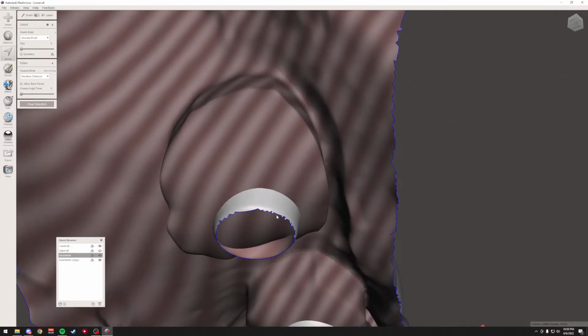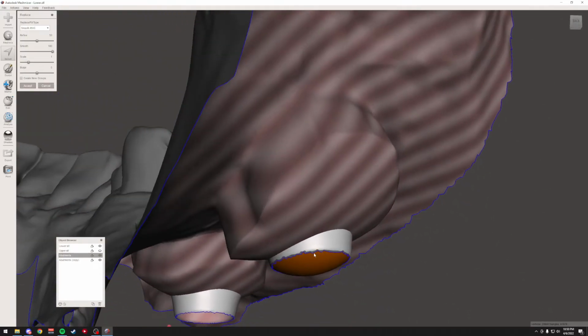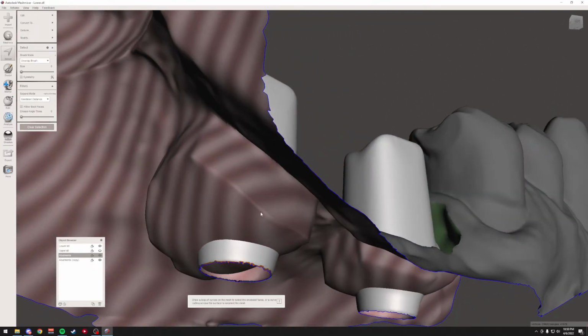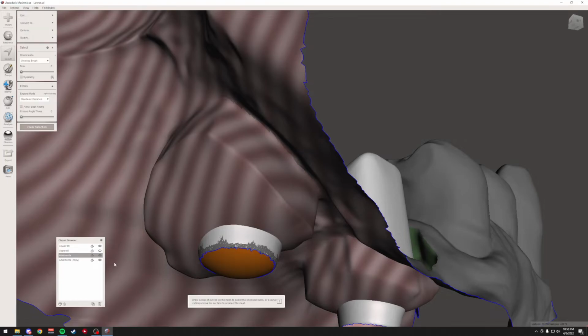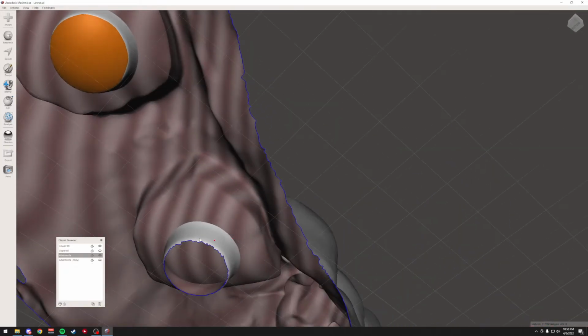So for this, because that's rough, you could probably just hit F and erase and fill that. That would work fine, but you can see areas where that's real jagged. I don't really like the way that looks. So I'm going to hit undo and we'll smooth that first with that boundary tool. And we'll hit OK and then F for fill and then accept. And you're seeing that gray is just this extra copy of abutments. I'll turn that off so you can see on this one.